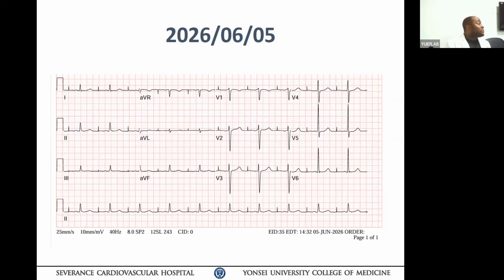This ECG was done last month, and again you see the same phenomenon. Looking at V1, after the pacing spike we see what's supposed to be the P wave. Any comment on the P wave over there? Because when you pace, you expect a single regular P wave. But over here, we have something much broader. Interatrial conduction delay, interatrial conduction delay.